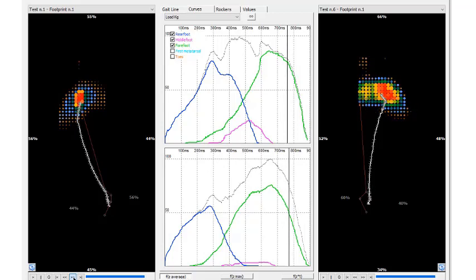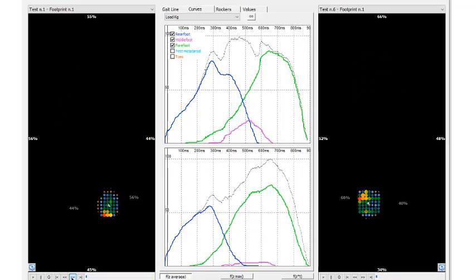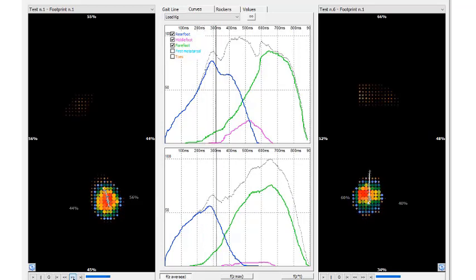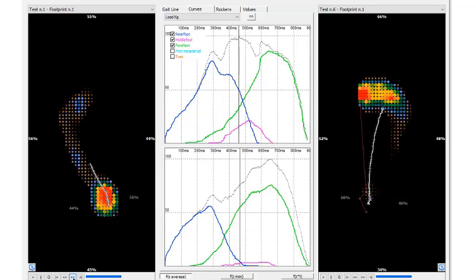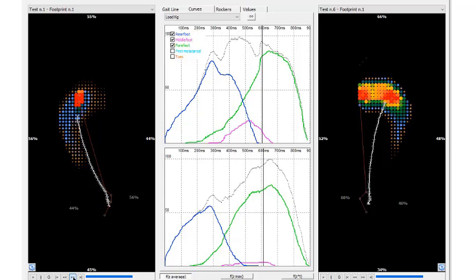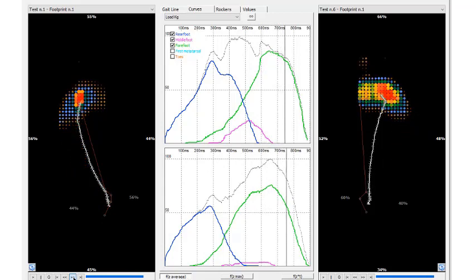In comparison, the peak pressure of the right foot travels from the heel onto the first MTP joint, with the center of pressure going through the second and third MTP joint, thus loading more tissues, spreading the loading as the weight travels through the forefoot. This is absolutely key to the risk status in the tissue loading of our area of concern.